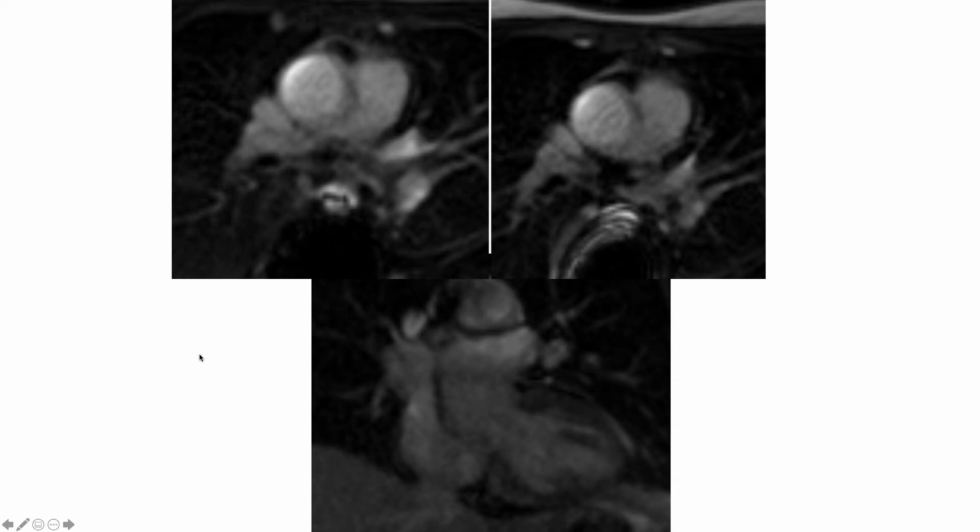Carol, MR here. Quick question before you show the next one on the CT. When you said you did a delayed CT and delayed enhancement, was that the 10 minutes like you would do for an MR, or how soon do you do it? I only waited about 1 minute, but I'm going to show you another one where we waited 8 minutes. Okay. And it's a patient that was quite interesting.